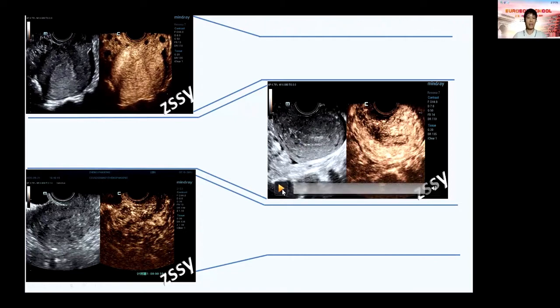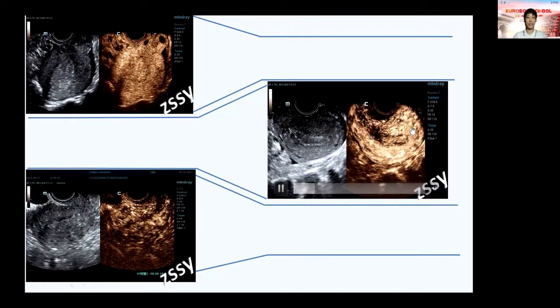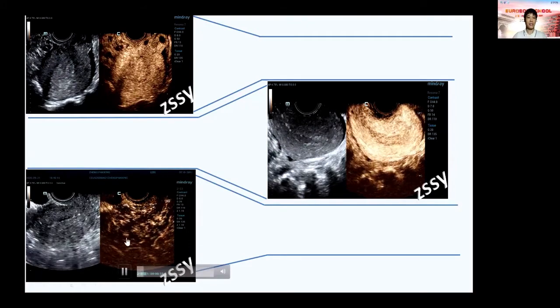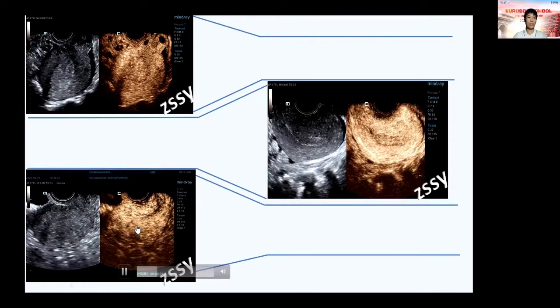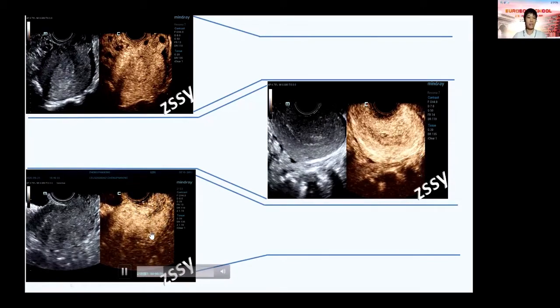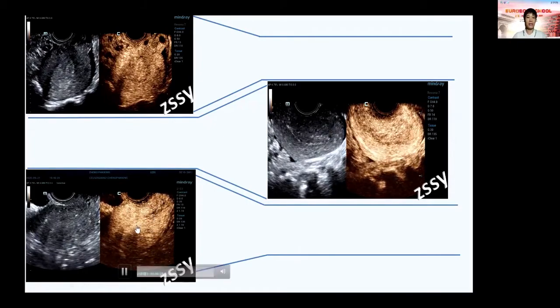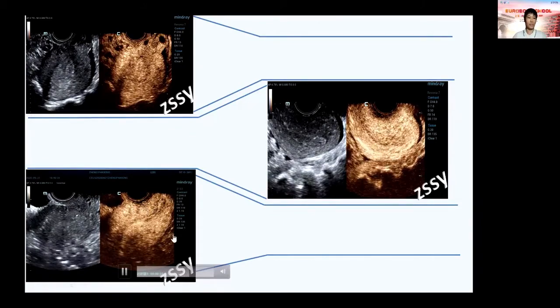Case B shows a synchronized enhancement with that of myometrium, and in case C, the arrival time of lesion area is also synchronized with the myometrium, vastly earlier than the rest of the endometrium. The signal intensity was also the iso enhancement.